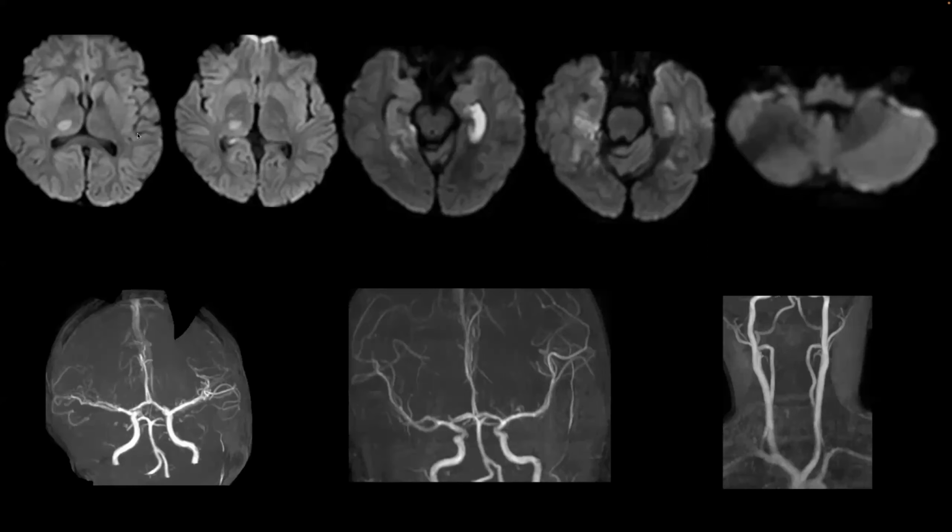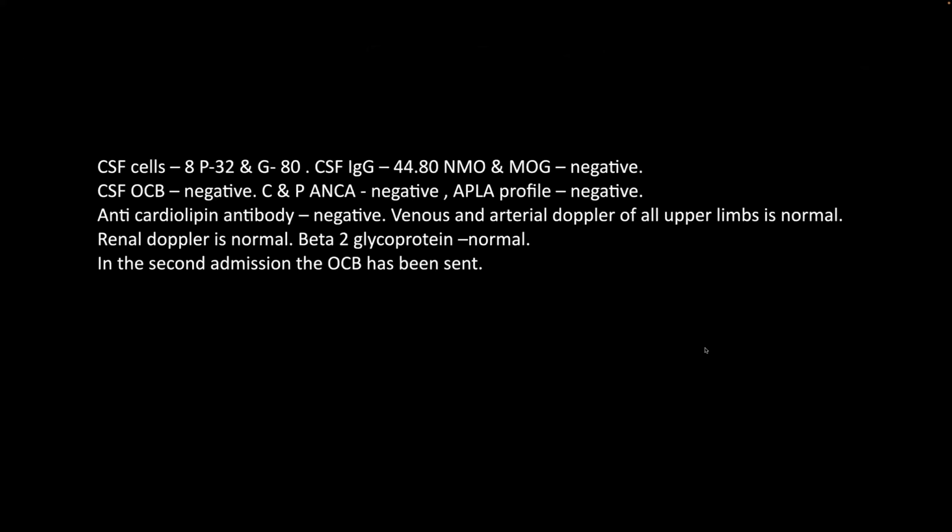Yeah, okay, you have ischemic changes in the thalami, predominantly on the right side. Also the bilateral mesial temporal lobes, left more than the right, and the occipital lobes. Subacute or acute ischemic changes in the posterior circulation territory. So cerebellar structures and the brainstem were relatively spared. On the angio, especially the vertebrobasilar arteries, I could not appreciate any stenosis or thrombosis. The vertebral arteries along the neck do not demonstrate any abnormalities.